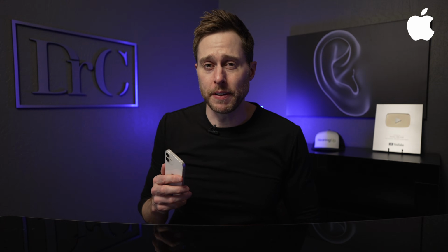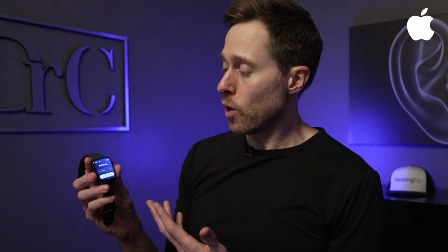All right, one other cool feature that you have with an Apple device that you do not have from an Android device is the ability to use an Apple Watch. So you can see that I have my Apple Watch here, and right now I am in my personal program. You can see that indicated here at the top. Now below that, you can see that I have a volume adjustment, and below that, you can see that I have activation of Edge Mode Plus.